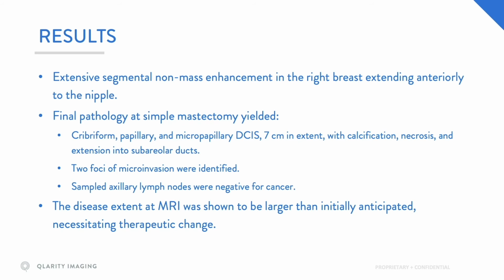So in this case, MRI really showed that the disease extent was much larger than initially anticipated at the site of the mammographic study and necessitated therapeutic change with simple mastectomy.